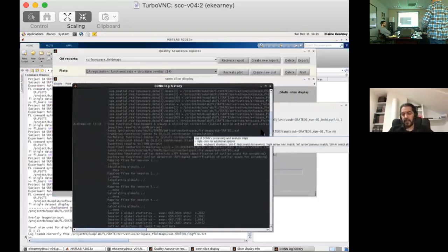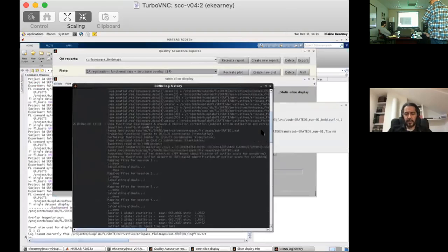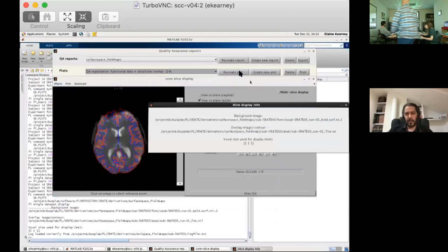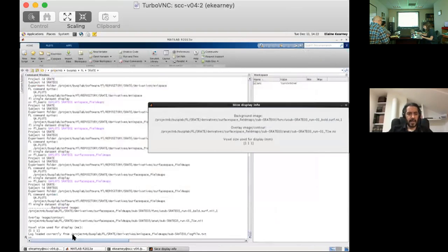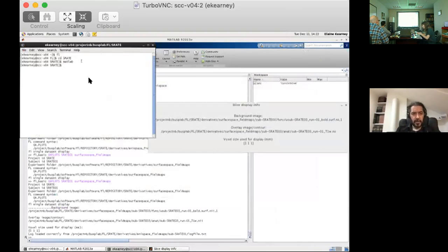So I see. That could be a problem with the field map generation then. One way to check that quickly would be to show, I probably should generate this as an additional plot, but if you go to the directory where the preprocessed data is for this subject, that would be in the derivatives folder, and then something called sub-03 for this subject, and then func for functional data. So do you want me to go there? Yeah, if you don't mind, I'll show you just quickly.